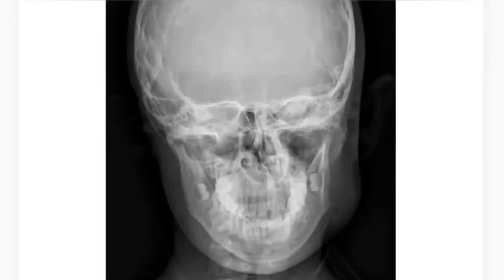This is an X-ray skull, frontal projection. There is a soft tissue swelling on the left side of the face, adjacent to the mandible. I cannot identify any calcification in it or any fluid level, so this is not an abscess. I think this is a soft tissue swelling with some fat lucencies that I can appreciate. It can be a lipoma.